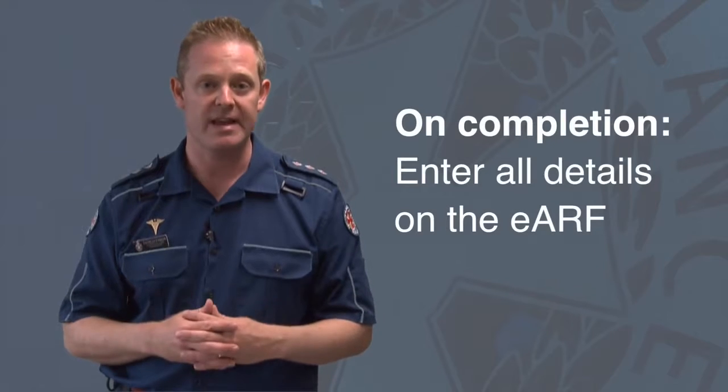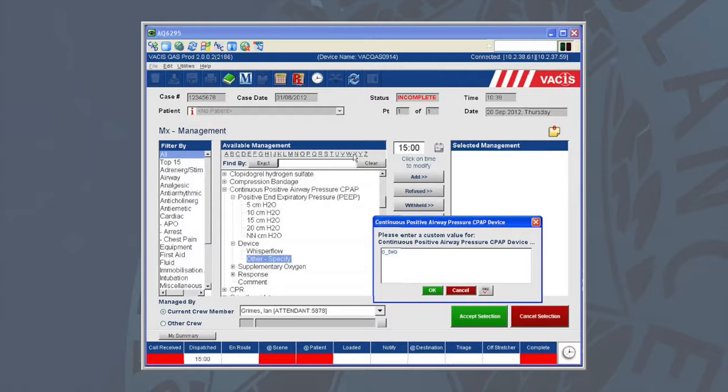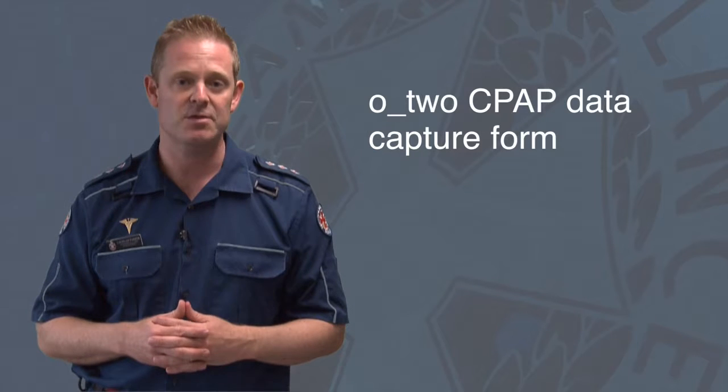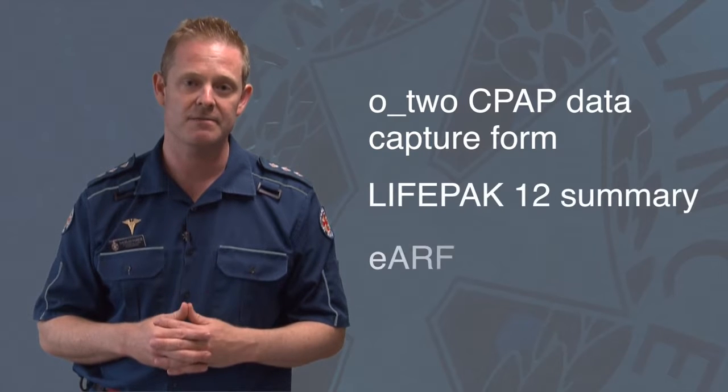On completion of the case, you'll be required to enter all details on the electronic ambulance report form. On the patient's management screen, you'll specifically see that we have listed continuous positive airway pressure CPAP as an intervention. You'll also be required to submit an O2 CPAP data capture form to the Medical Director's Office, along with the LifePack 12 summary and the EARF.